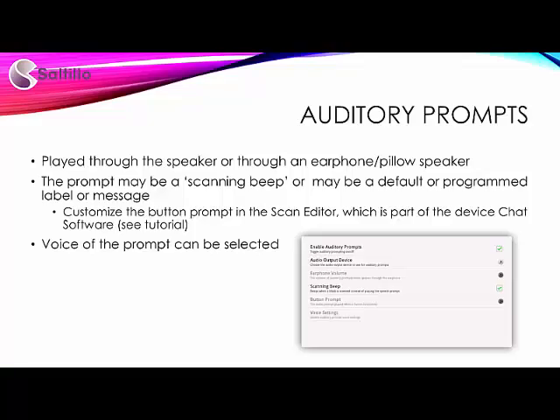I love it. Next, I will discuss auditory prompts. Does a client need auditory prompts? Are they visually impaired? Do they perform optimally with auditory feedback as well as visual feedback? If yes, then auditory prompts might be a fit. The chat software offers customization of how the prompts are heard. The auditory prompts may be played through a speaker, earphone, or pillow speaker.